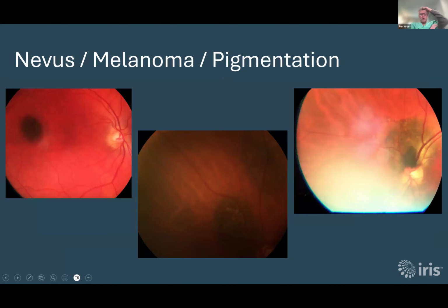The last things are things that are rare but really important. If within the image that we have, we see these big brown dots, there are a couple of possibilities. Could it be a nevus, which is just a freckle, which happens here as well as it does everywhere else, or is it a melanoma? And obviously those are quite different. In order to differentiate those, again, you need other testing than just a picture to allow us to do that. But very important: the risk of melanoma, these are life-threatening things if they're not identified.